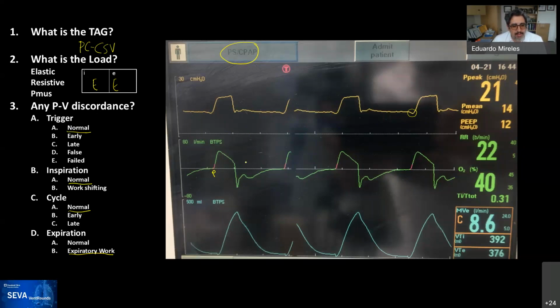And then all of the breaths are cycled by the patient, and we know that because of the tag that is over here. This patient is very regular. If you can see, the tidal volume doesn't change much, and sometimes that may create challenges in reading these waveforms because when patients lose their variability, like in this case, the inspiratory times will look exactly the same.